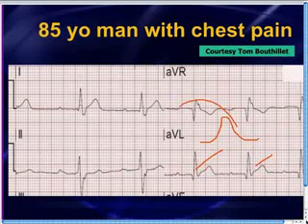In this particular case, it's very straight in appearance, and when T waves start to look very straight, I refer to that as hyperacute appearance. Other people may not, but I think that represents hyperacute or early ischemic T waves, when the initial part of the T wave starts getting straight, because a lot of times you repeat the 12-lead a little bit later, and then they're starting to get more convex upwards.